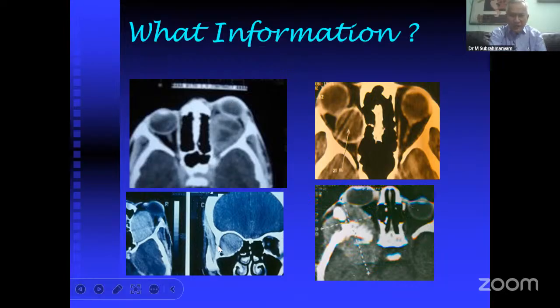And what does this show? This CT scan, the coronal section, shows a very big mass, with the nerve being compressed and the entire orbital space occupied by it. So it's a solid, uniform mass with clear-cut borders, again a benign lesion.